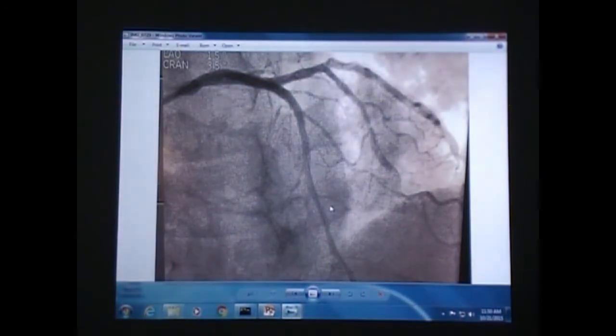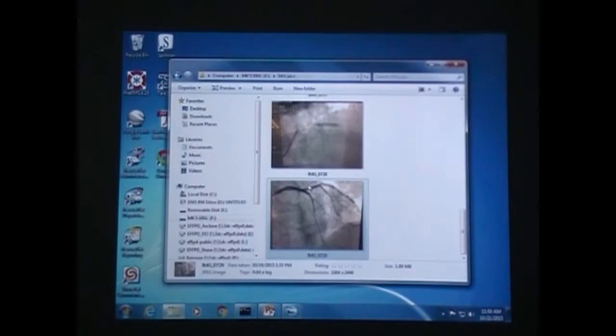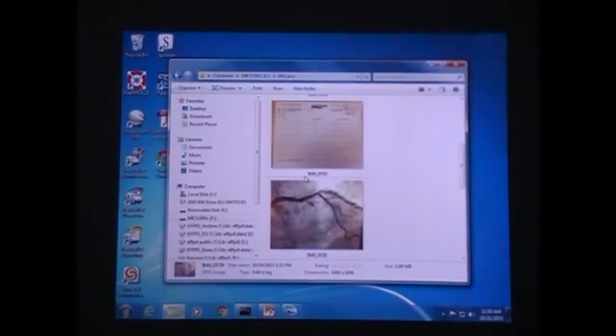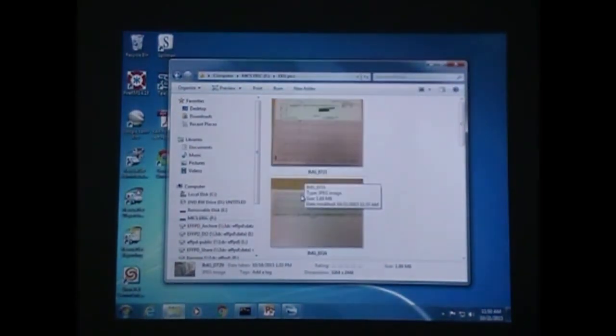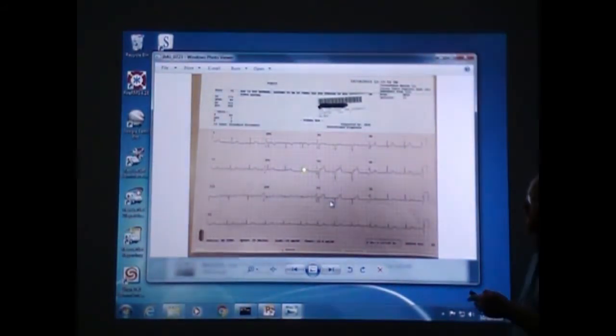But you saw, looking at that EKG, that was one lead. Let's go back and look at that EKG just for a second. I talked about earlier that it was only V2. You wouldn't think that that's 100% LAD from that EKG. But cueing in on the reciprocal changes that are possibly going on here, her clinical condition, she looks sick. She was gray. You could tell she's in significant pain, and we've got this right here, okay?